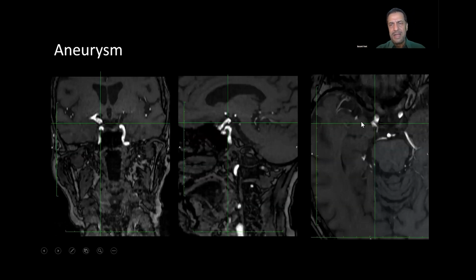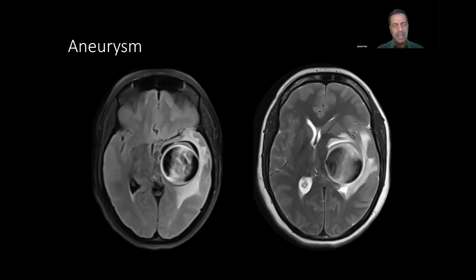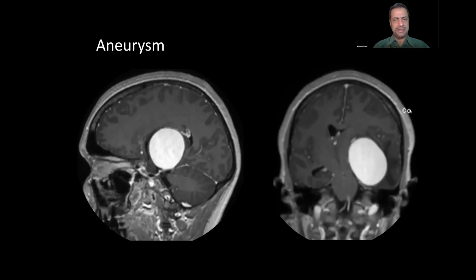You can see an aneurysm like this on MR angiography, but I will talk about this in another slide. Sometimes these can look like a foreign body or tumor in the brain, but you can see that there are flow artifacts there, and a lot of void area, and the wall is very sharp, a clean-cut wall. So a giant aneurysm will look like this.